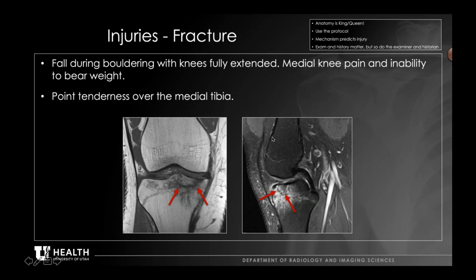You have this very large femur, right, that just kind of smashes into the tibia, causes a little bit of impaction. Lots of bleeding and edema in the bone causes this increased signal, and it was all consistent with a tibial plateau fracture. In this case, it's not very depressed. You can see that it almost has a normal morphologic appearance of the bone and the cortical surface, and so this one may have just healed with non-weight bearing.